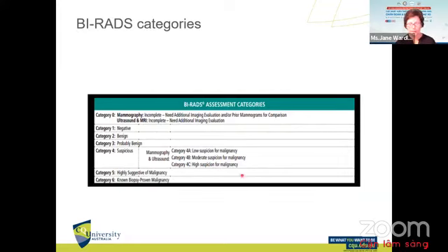And what Covington is saying quite recently, in a paper from March 2022 that I read, is that elastography is helping the categorization between categories 3 and 4. Adding the characteristic of the stiffness of the mass can help decide whether the patient needs to be followed up more aggressively, or whether it can be a softer follow-up, perhaps just a follow-up ultrasound in 6 months or something along those lines. So elastography is helping the categories between BI-RADS 3 and BI-RADS 4.